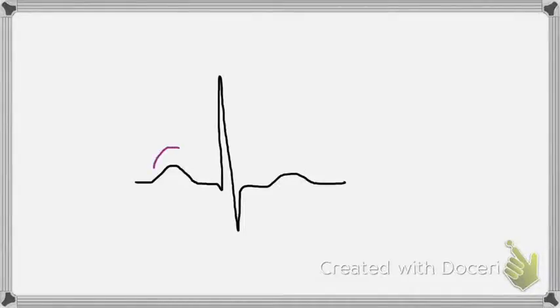And right here we're going to talk about this, and this is called the P wave.